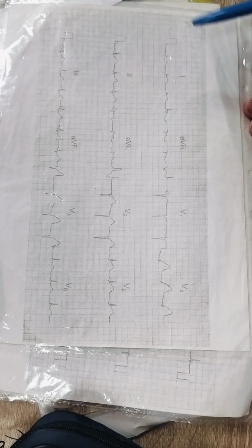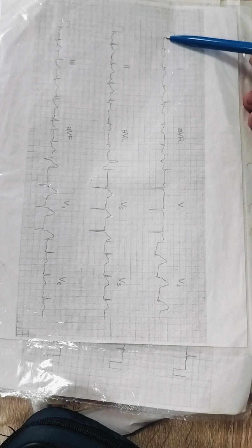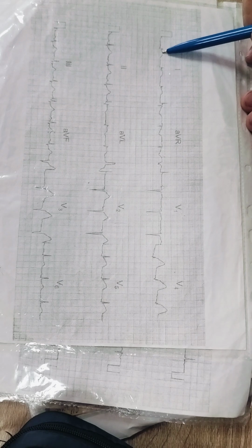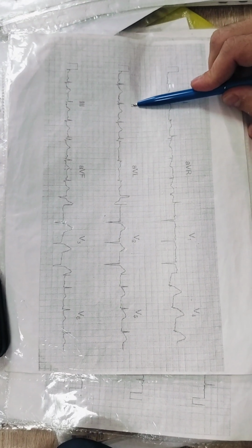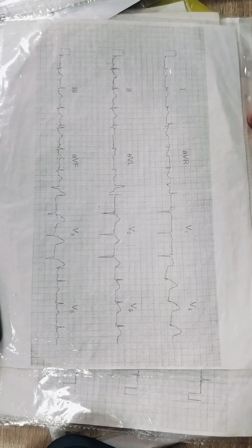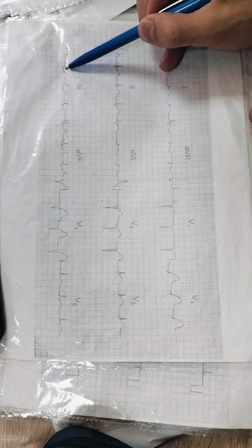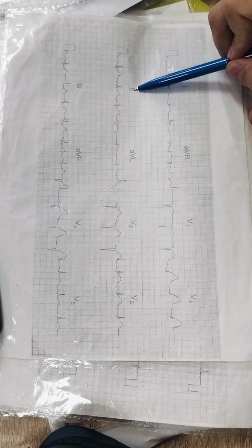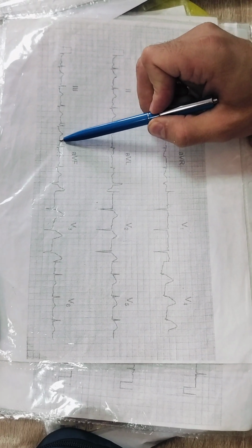Tachycardia was possible. Next, changes of wave segments and intervals in each lead. Lead number 1, ST segment is elevated, above the isoelectric line. Ischemic. Second lead, T wave is in size like an R wave. It's big. Third lead, ST segment below the isoelectric line. There are changes in the second and third. AVF, ST segment below the isoelectric line.